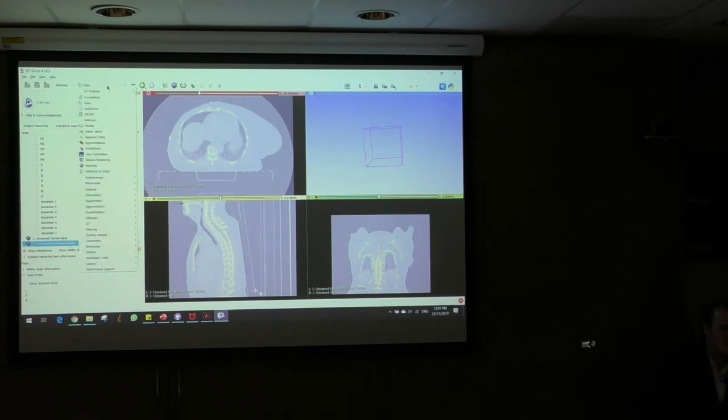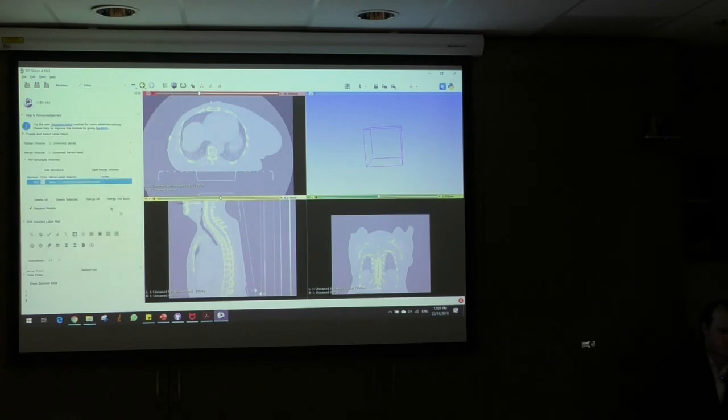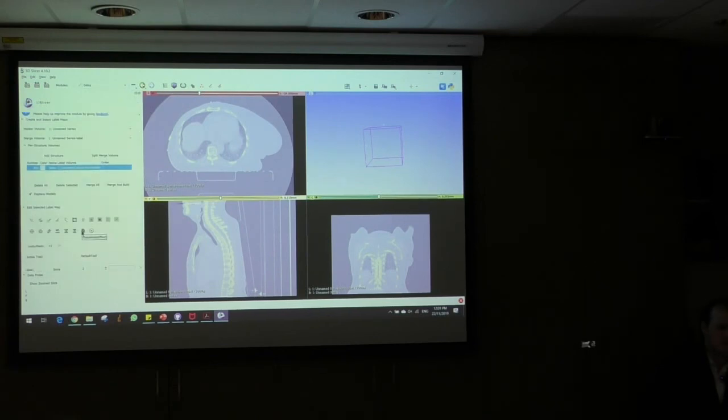So in the previous screen, the editor, we've selected our area, and then through here we can click Make Model Effect. Now, what this does is it generates the 3D structure. This make model effect creates your three-dimensional structure of what you've just contoured. So it creates that segmentation label and combines all of those contours together to create your 3D volume. And this process might take a little bit of time.